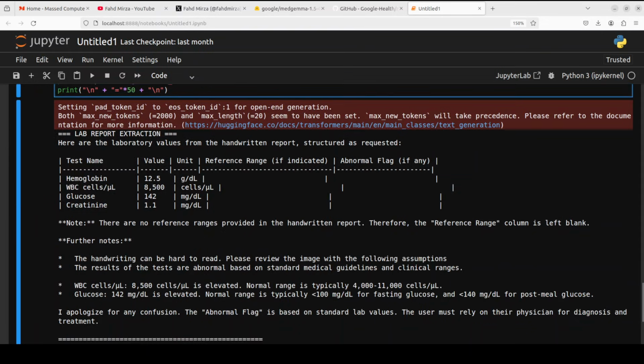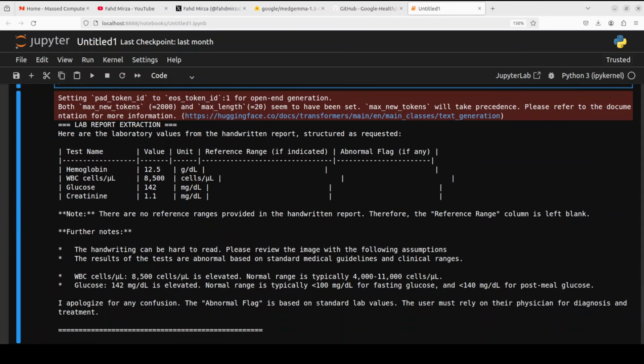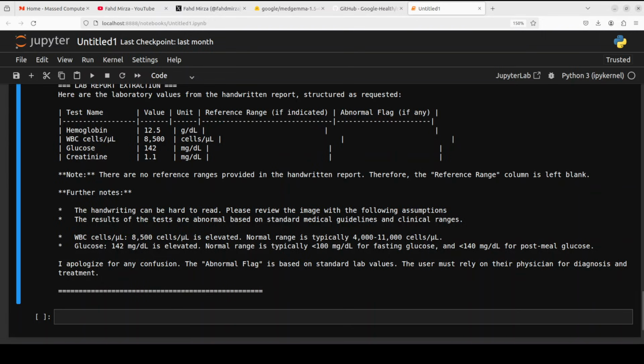There you go. Takes sweet time, but done wonderfully well. But again, I will take a physician's advice. It got confused a bit, but I did that on purpose, so it has also put it in there. I think it's a very quality answer. So the hallucination ratio is low, but still, you never know.